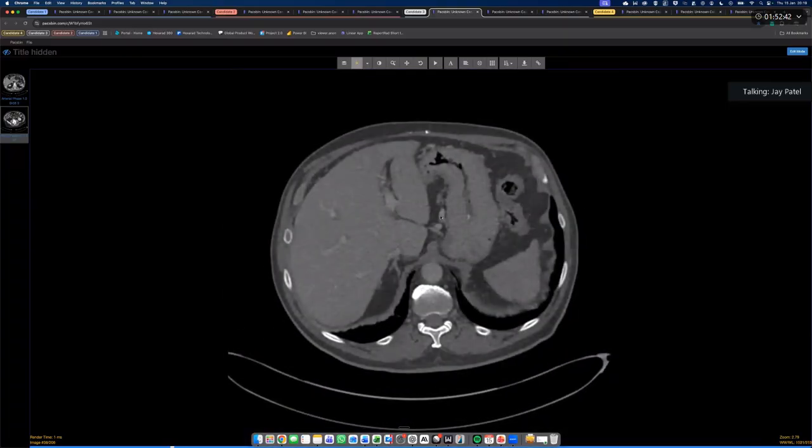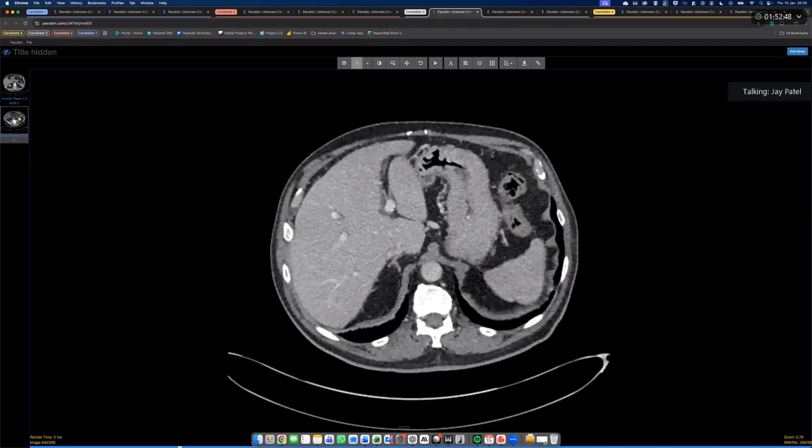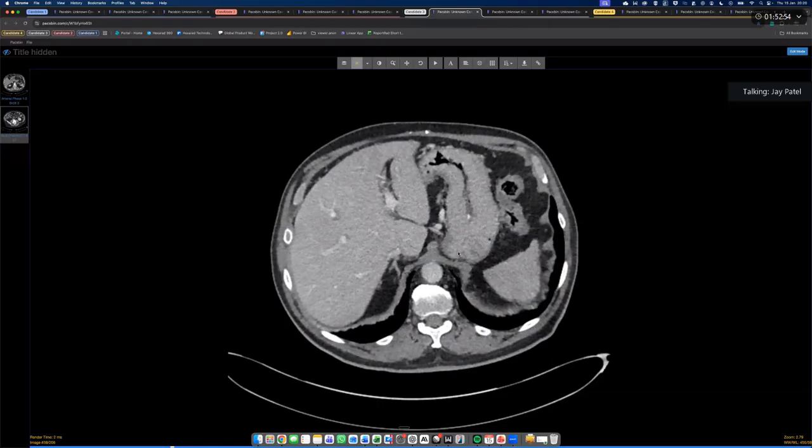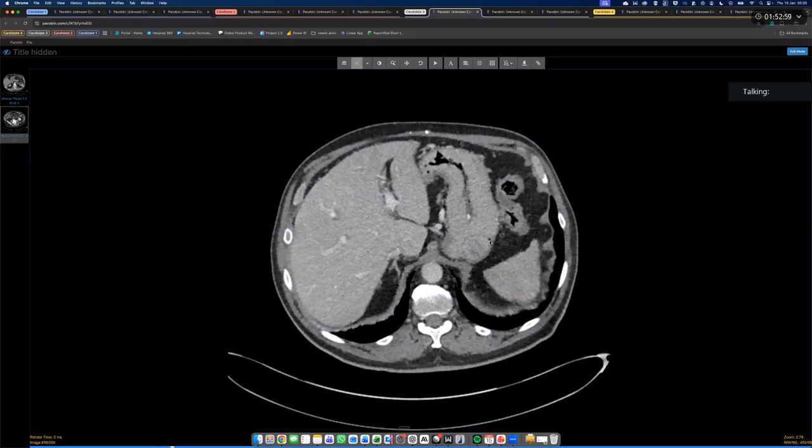You raised the concept of a thickened stomach wall. And actually, I think for most general radiologists, they would also raise that as a concern. I think that's reasonable as a raise. Just a tip, if you see gas locules peripherally in what looks like a thickened wall, it's just collapsed rugal folds. Think about it.